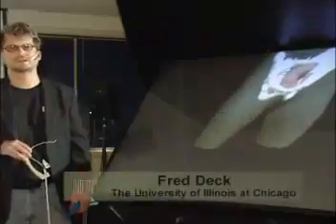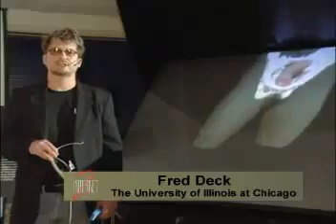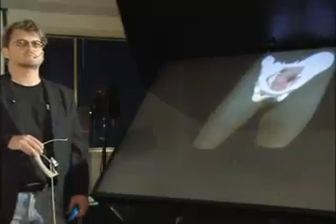Hi, I'm Fred Deck. I'm with the University of Illinois at Chicago, and we have here a telecollaborative application between Washington, D.C. and Chicago. This is an application called the Virtual Pelvic Floor, and we're connected live via internet with the Virtual Reality and Medicine Laboratory at Chicago and Dr. Russ Pearl. Russ? Good morning.